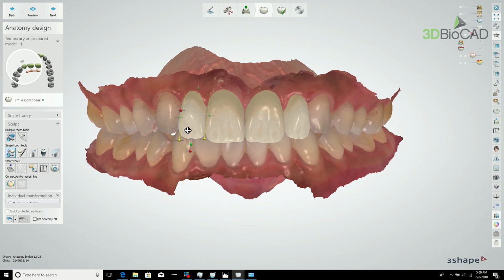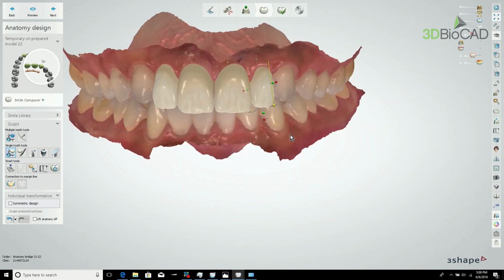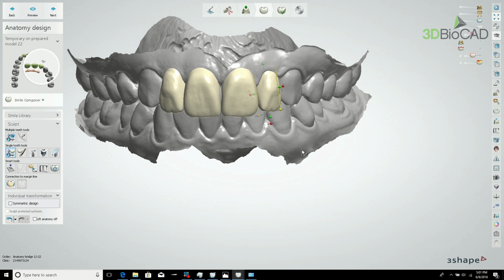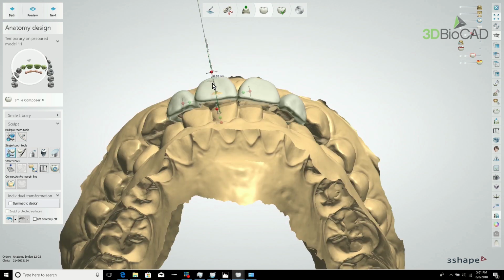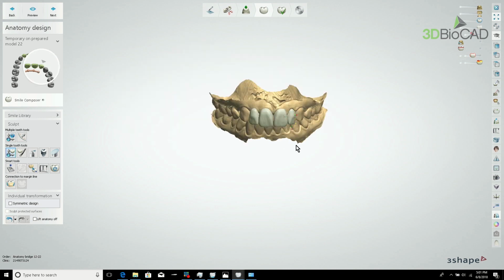So let's say we do the design like this quickly, and we are all technicians, right? Color always looks good, but for checking the detail, we want to see non-color. So check with non-color too. So make it nice. Okay, this is your job. Let's say we have a nice design.